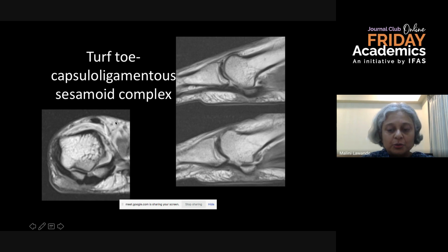So when I acquire high resolution images for just the forefoot only or the great toe, you can see this kind of resolution, and you can see here, this is the plantar plate here. This is the FHL tendon. These here are the hallux sesamoids. This is the intersesamoid ligament, this bit, and then is the FHL tendon. As you come, this is the midline.